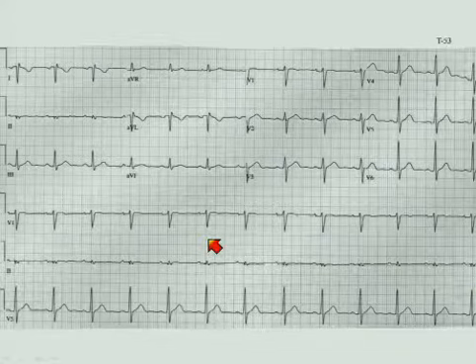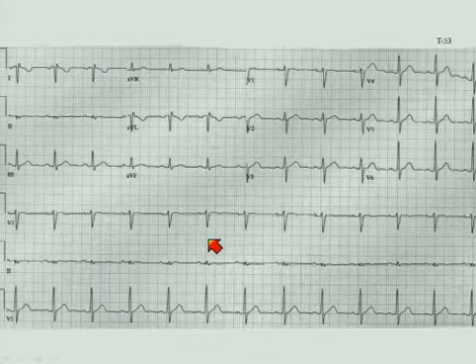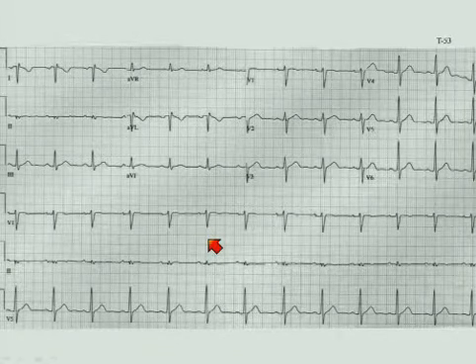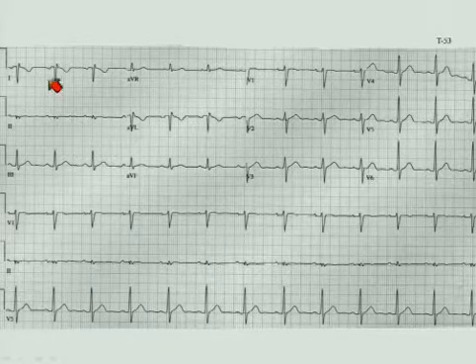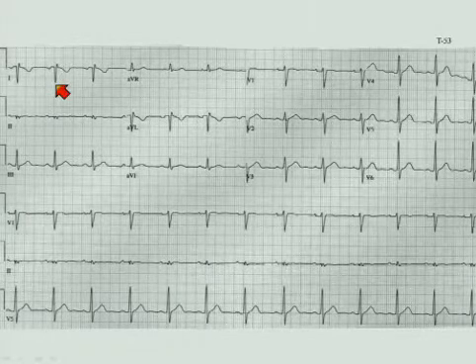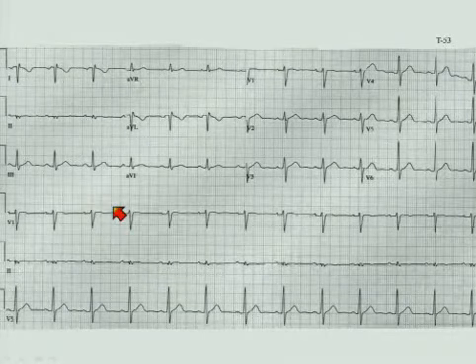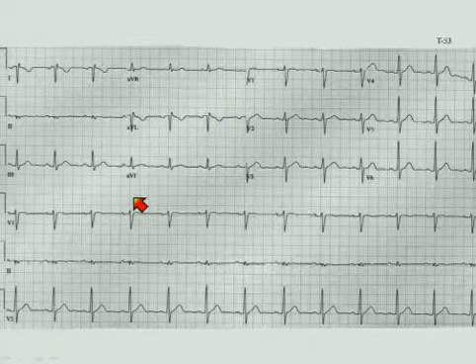This is the most common error in obtaining electrocardiograms, and this is limb cable reversal, resulting in a pattern here with negative P wave and QRS, upright in AVR, and this is left and right arm cable reversal. The differential diagnosis is what?